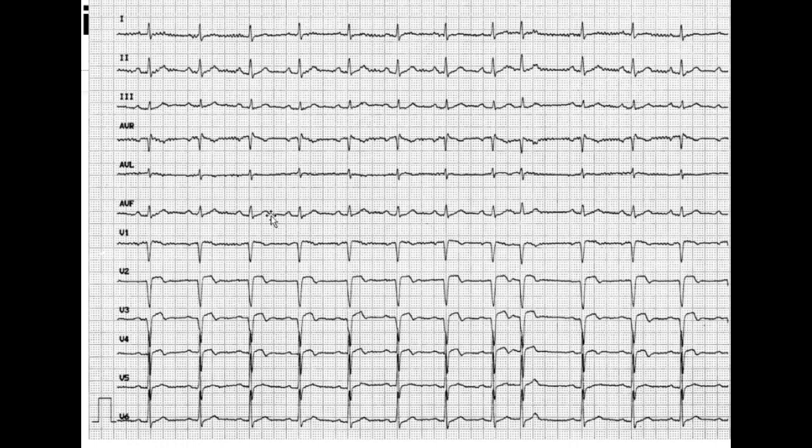The diagnosis in this case is supraventricular extrasystole, one of them, and there's also an acute myocardial infarction in the anterior-septal location, because you can see that there are significant ST elevations in leads V2, V3, and V4. And this is with corresponding ST depressions in leads 2 and AVF.